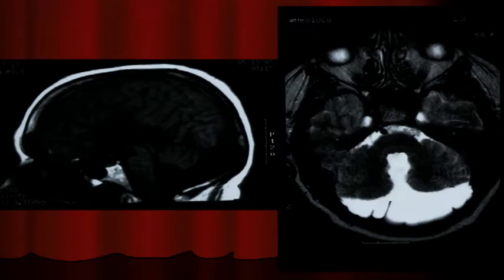I don't know why this looks so dark. Here you can see the upper half of the cerebellar vermis, but you don't have the lower half. I don't know why it's doing this, because it looks good here, looks terrible there, looks terrible here. But here it is communicating with a big old cyst, and here you can see there's a big posterior fossa cyst. So this is in what family? Dandy Walker family, Dandy Walker malformation. What's the mildest spectrum?